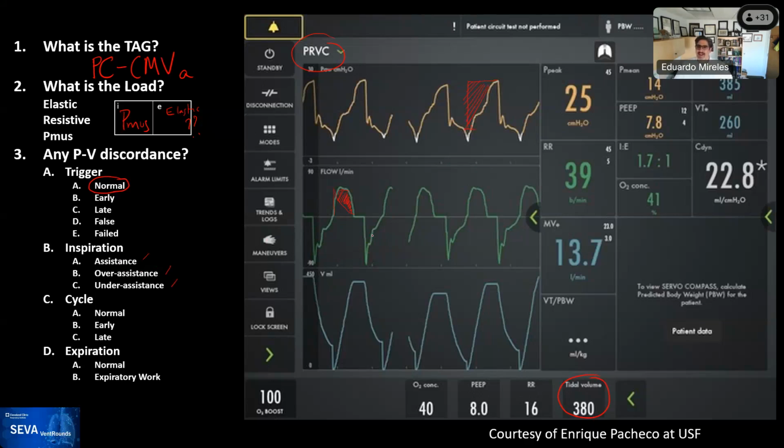And I love this because a lot of, so I'm hearing under assistance, and our classification, what we have said is, well, if the pressure drops below the baseline, then that's under assistance, definitely. But there is a period that, I mean, you can see how the pressure is coming down. There's a lot of effort. So there's a fair amount of work shifting. And we talked last week about how work shifting has a degree and probably a kind of a U-shaped work shifting.